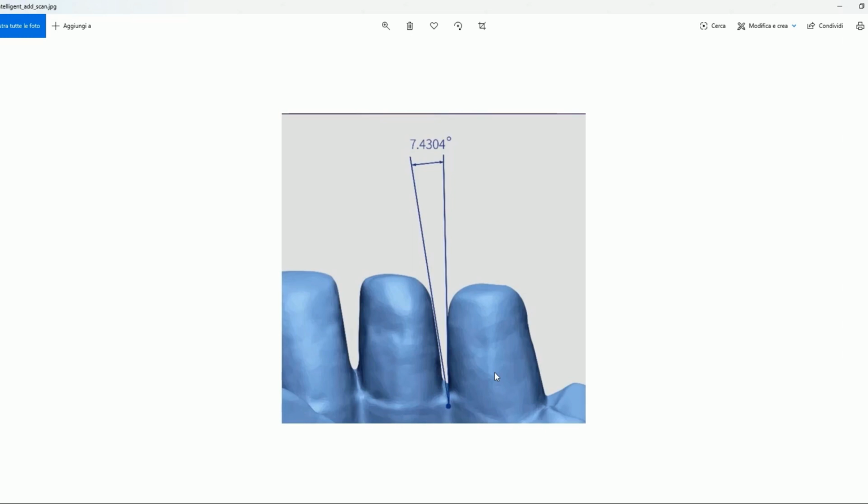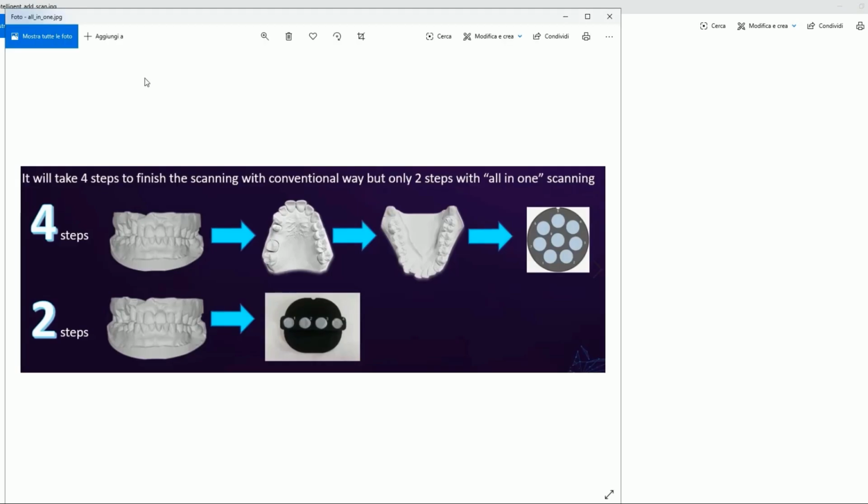The intelligent planned scan path and scientific algorithm can capture more narrow area data so that also the non-separated models can be acquired with more details easily. It is a great function, really.